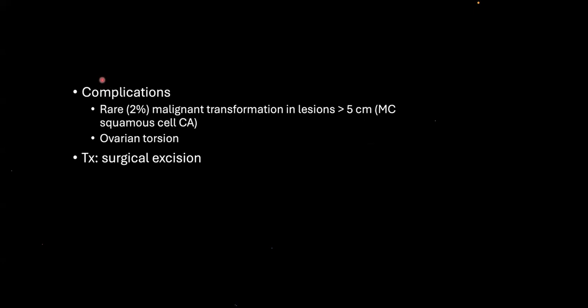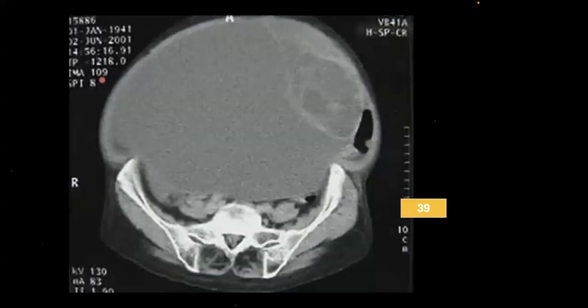Okay, we'll come up with that later. I don't know which one you're calling. The molar one. There were cystic spaces on MRI. Did you see that? There were cystic spaces typical of the molar grape structure appearance.